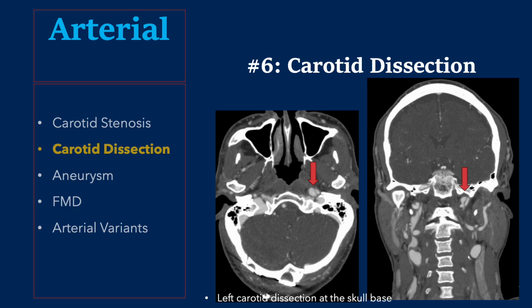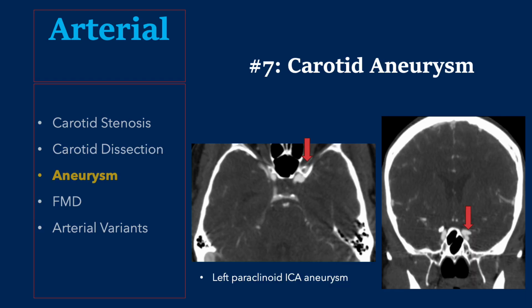This patient presented with a left carotid dissection and pseudoaneurysm at the skull base. This patient had a left paraclinoid aneurysm that was subsequently coiled.